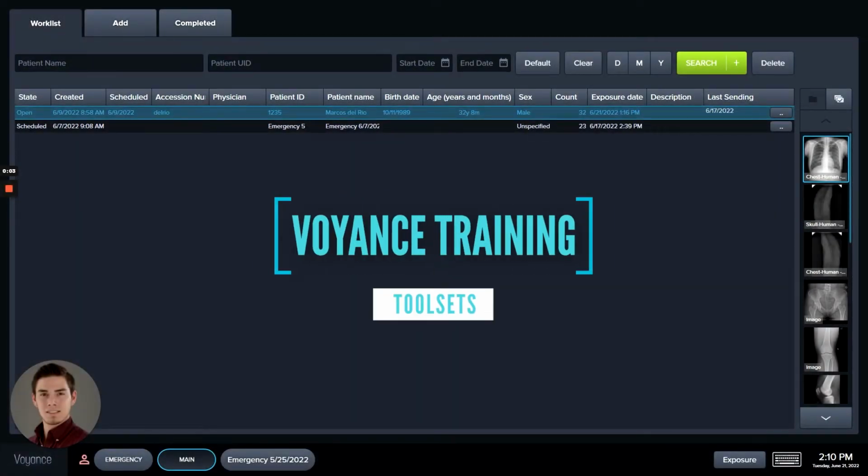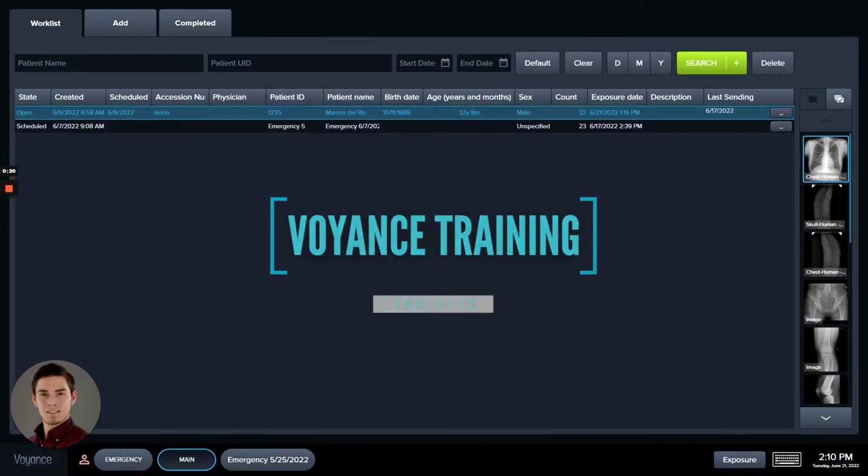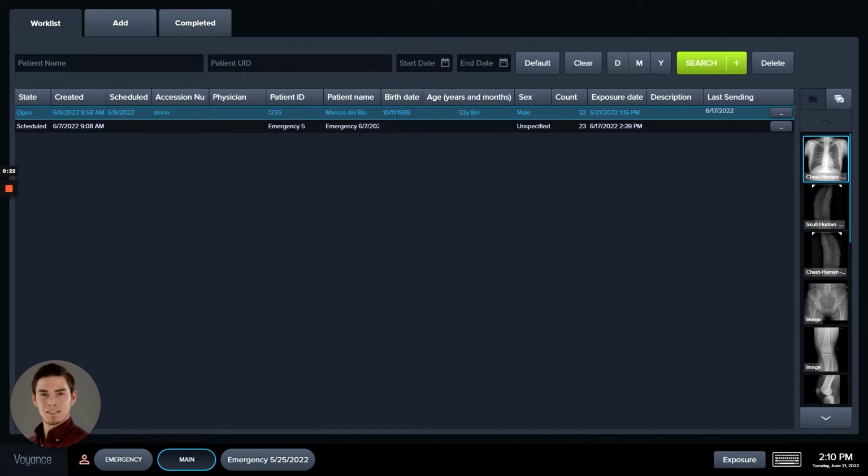Today we're going to be going over some of the tools that come with the Voyance acquisition and Voyance viewer software. We're going to be going over all the way from the basic tools, the image editing tools, some keyboard shortcuts, all the way to some advanced tool sets that chiropractors use, some specialized things here and there.